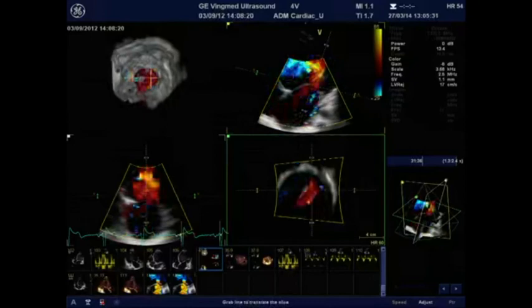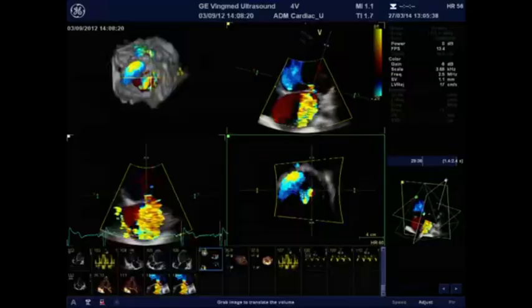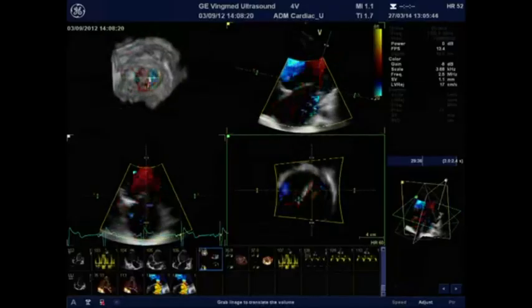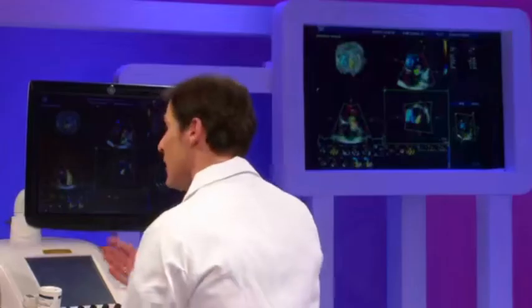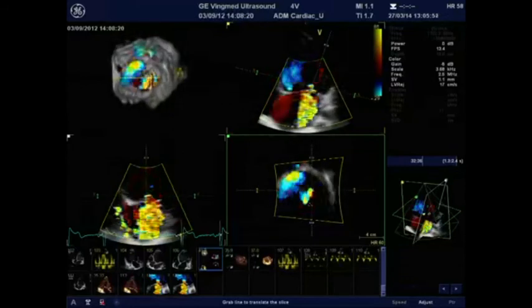This is the regurgitant flow at the level of the regurgitant orifice, and you have the shape. So this means that it's the real vena contracta, and if you measure it, you will have the vena contracta area. If you look at the geometry and the shape, it appears completely elongated, not round at all, as you assume when you think that the regurgitant orifice is purely circular.